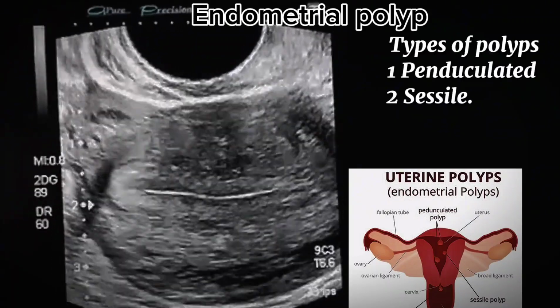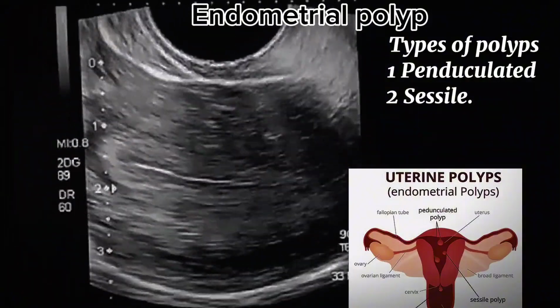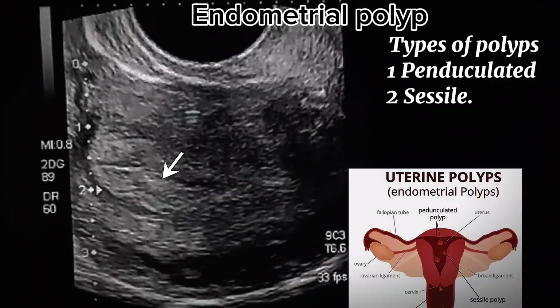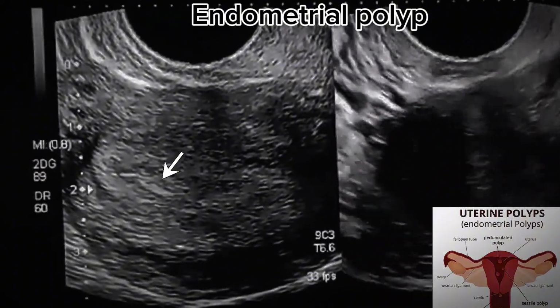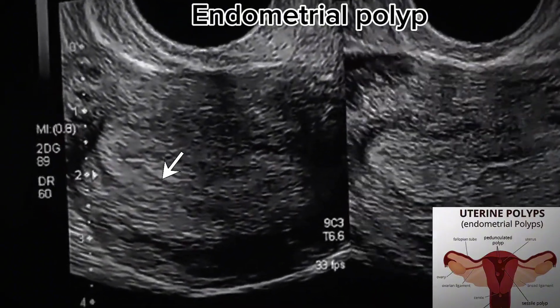Polyps may be pedunculated or sessile. The pedunculated polyps are attached to the wall by a thin stalk which shows vascularity on color Doppler. Sessile polyps are normally broad-based. Color Doppler can show single feeding vessel going into the polyp.